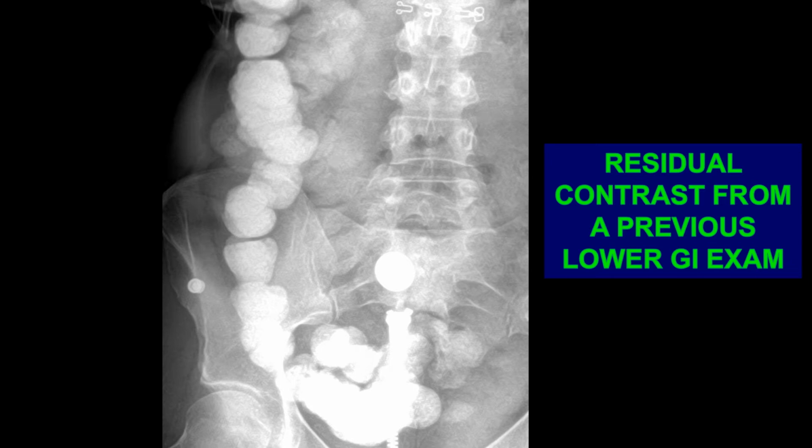So if the patient has any other types of imaging, such as this X-ray, this residual contrast can be visualized, and you don't want to mistake it for some type of osseous lesion or tumor. Rather, understand that this is residual contrast from a previous lower GI exam.